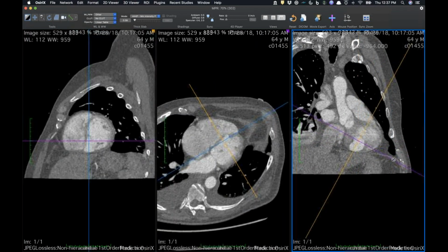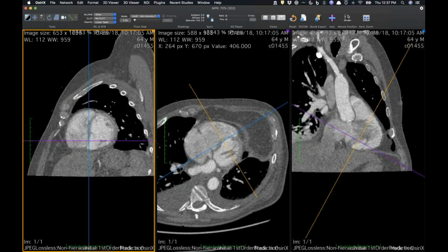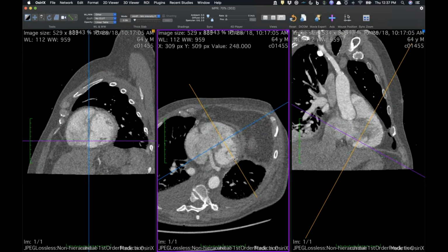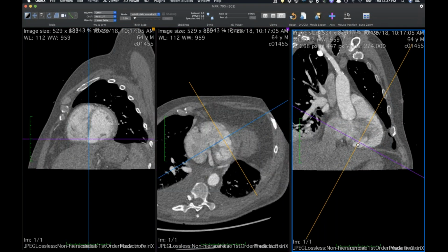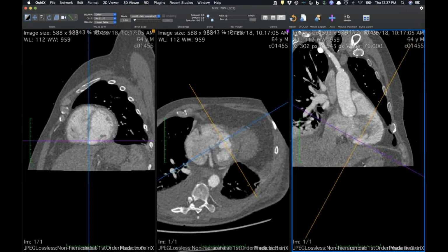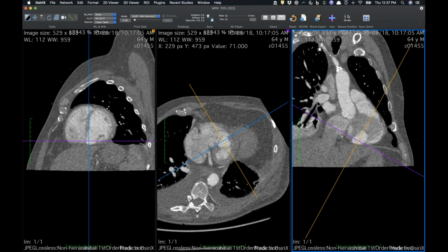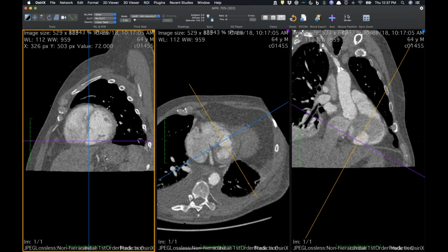Yeah, because the other thing too, and I had one a couple years ago where it was right in the same place, inferior wall, that ruptured into the right ventricle, but also out into the pericardium, because the patient had hemopericardium and tamponade too. And I don't know how you plug this thing, because you're right at the base. It's not like it's right in the middle of the interventricular septum.